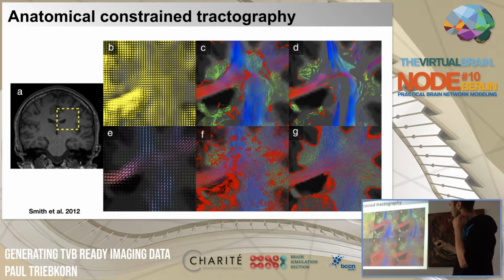Now we use anatomical constraint tractography on this one, and these streamlines get deleted, right? Because they're implausible, they're ending inside white matter. And what we remain with is this image here. There are empty spaces because these streamlines were deleted, and there's now an underrepresentation of these fibers in here. So it's quite troublesome that using this imaging technique, these diffusion tensors, tracking and then deletion, leaves us with less plausible images.